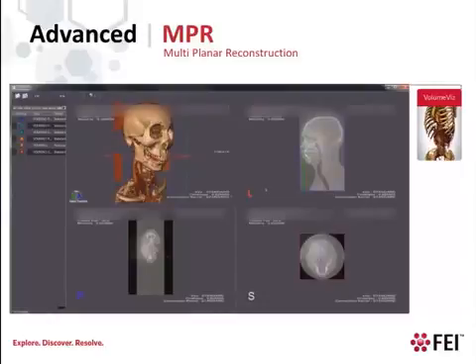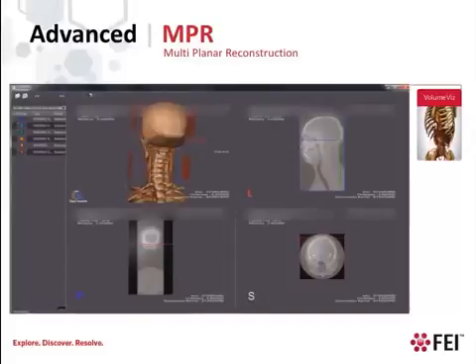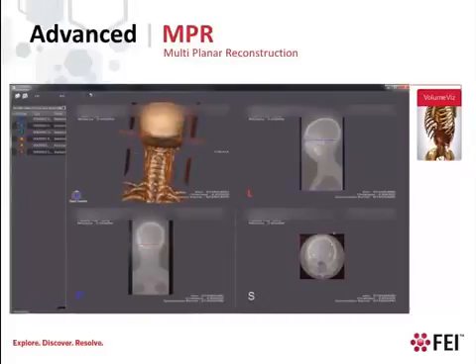Likewise, we can click on a 2D slice, get the cursor position in the 3D volume. We'll use that information in a similar way to update the other 2 2D slices. The picking mechanism can also tell us the value of the voxel that we're pointing to on a slice or a volume.